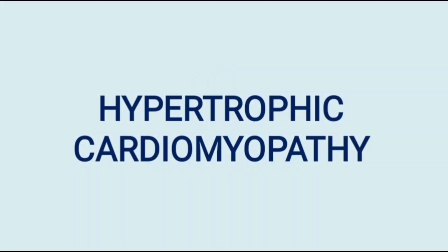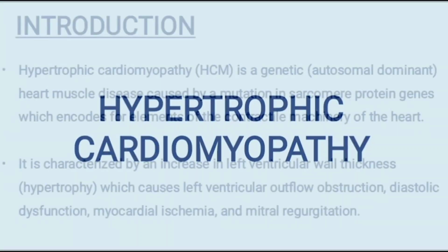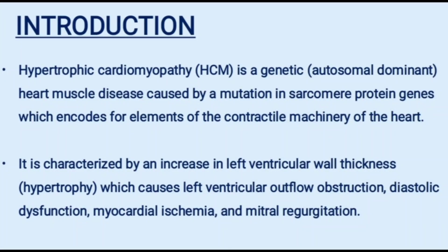So today we'll be discussing hypertrophic cardiomyopathy and, more importantly, its echocardiographic evaluation. So first, let us understand what is hypertrophic cardiomyopathy. It is the most common genetic cardiac muscle disease caused by a mutation in sarcomere protein genes, which encode elements of the contractile machinery of the heart.